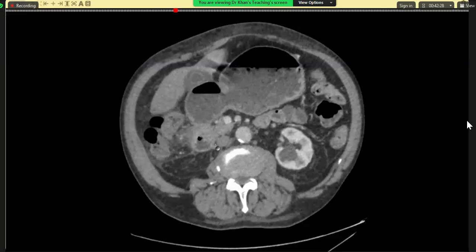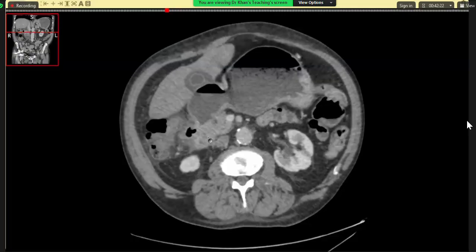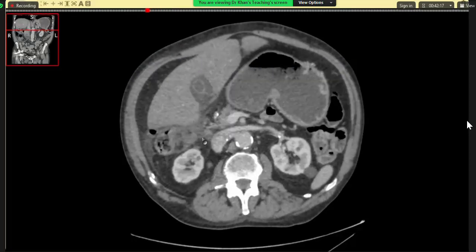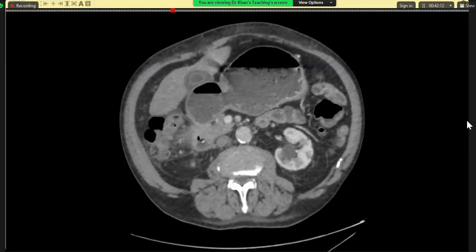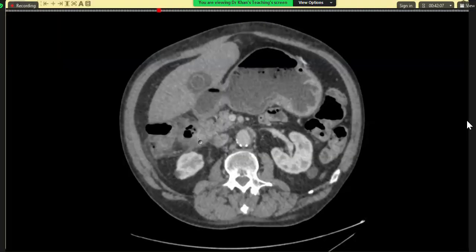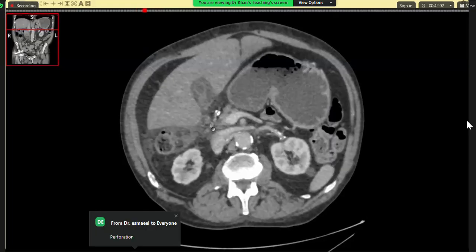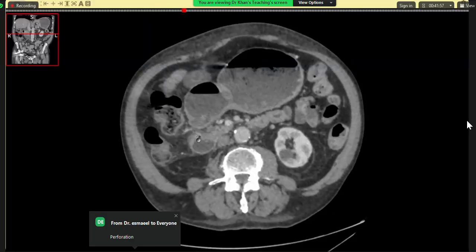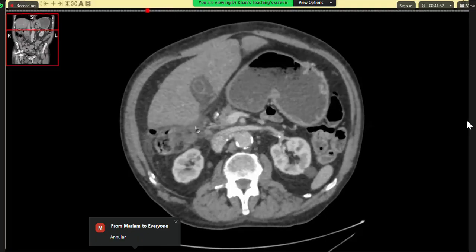There's nothing. Anything else? So of the gallbladder, you are saying? Yeah, disregard the gallbladder findings. Okay, there was a thickening also of the first part of the duodenum, I think, right over here in the region. So this could be, I am looking for any fluid surrounding this in the region of the gastric pylorus.